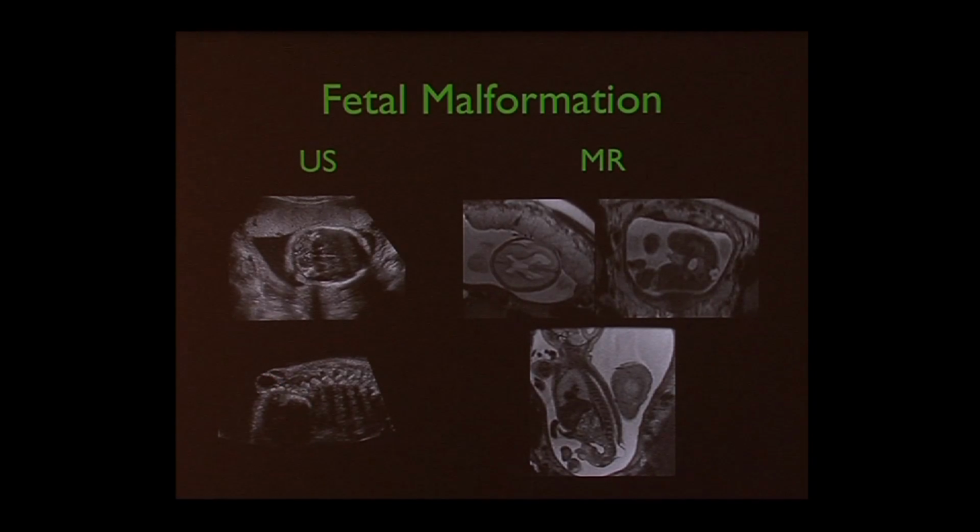And we can also do MR in obstetrical patients. So here's the baby's head. The front of the head is here in this particular case, and these are ventricles, the fluid-filled areas inside the head, which are distended in this fetus. Here is the pelvis, where that outpouching is.